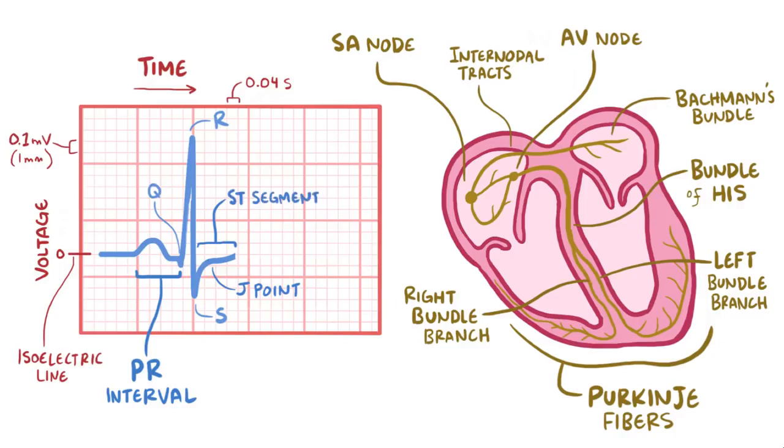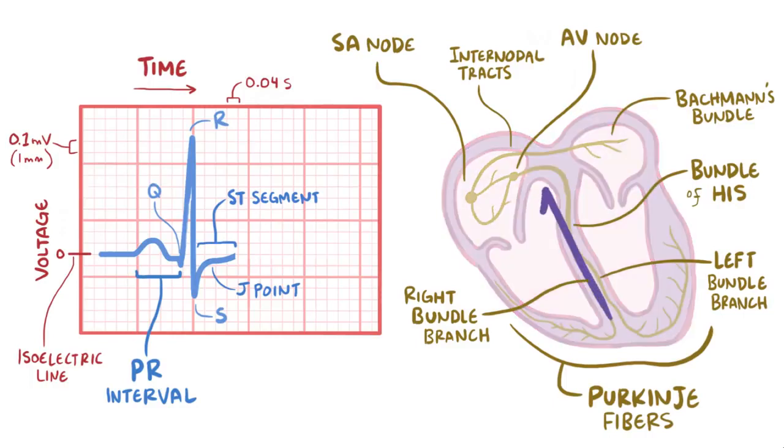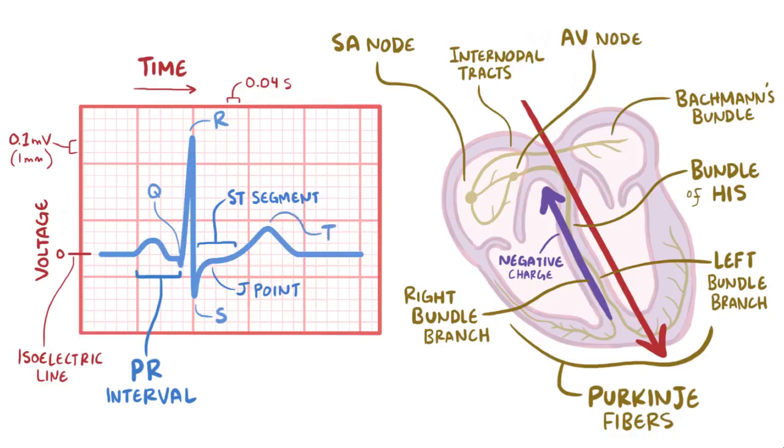After that, the ventricles have to repolarize, or become negative again, to reset themselves in preparation for another wave of depolarization. Now, repolarization moves in an overall direction upward, opposite the direction of lead 2. So you might think that it should be a negative deflection, right? But really it's still a positive deflection, since this time it's a wave of negative charge. So essentially now when it's moving opposite to lead 2, it's a positive deflection on the ECG. And this final wave is called the T wave.